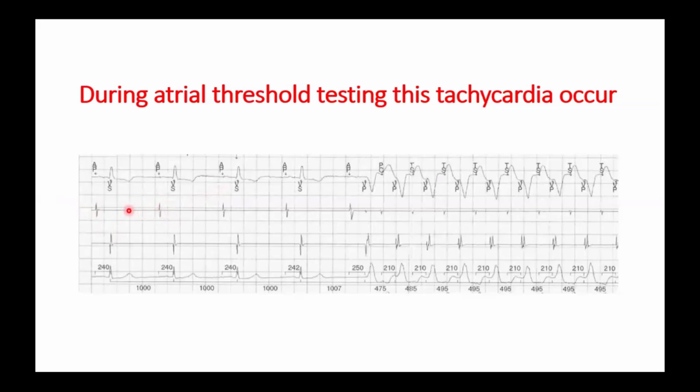As we said before, when there is an intrinsic conduction, we should notice both the channels. Here there is atrial pacing followed by ventricular sensing, in a DDD mode.